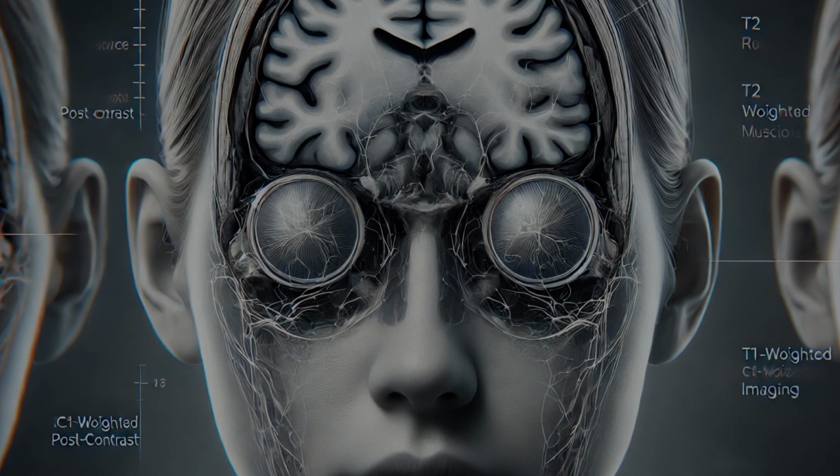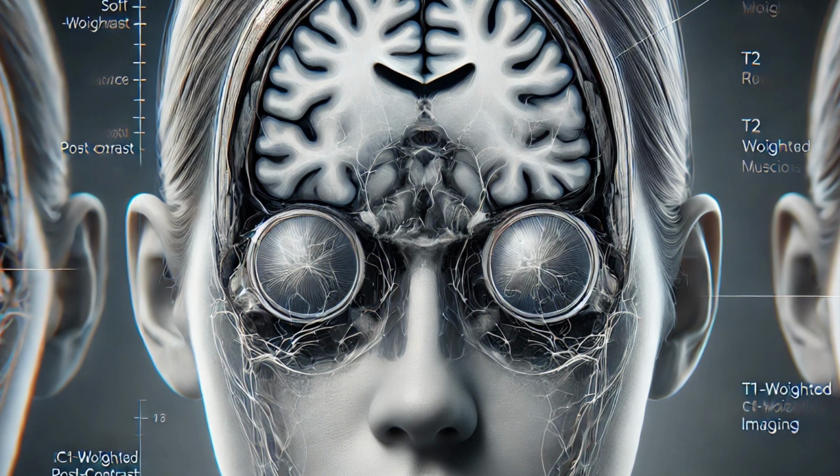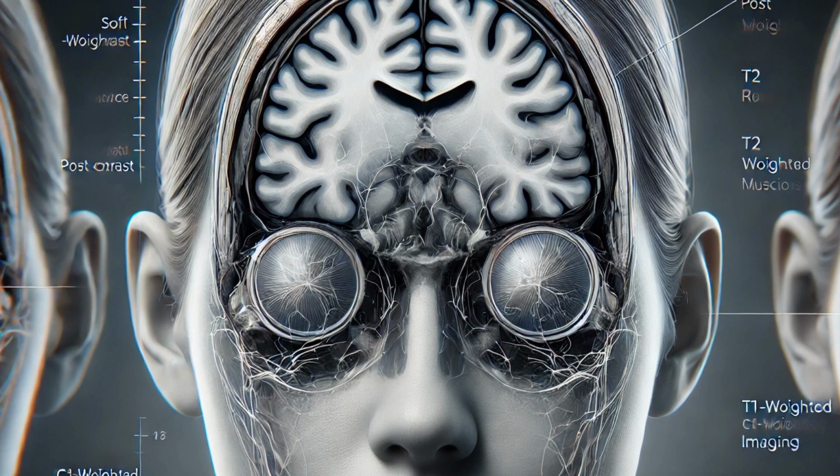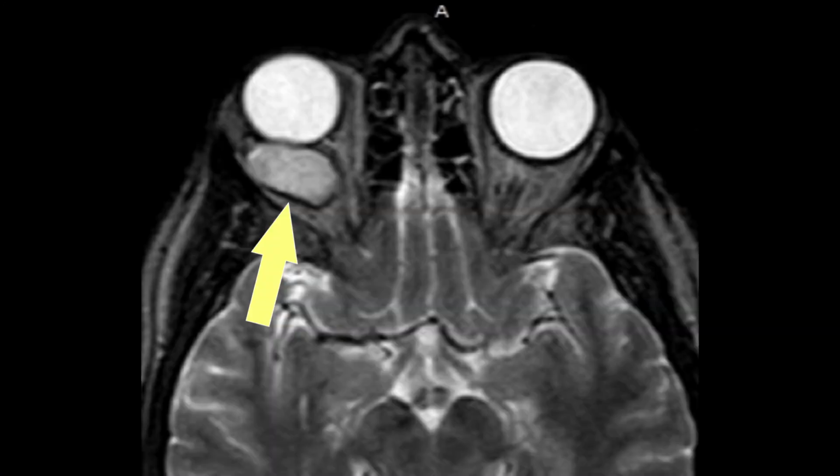This is a 49-year-old woman who presented with blurred vision. In this case, the available imaging study is a magnetic resonance imaging examination of the orbits with axial T2 weighted sequences. On the T2 weighted images, there is a well-defined intraorbital mass located predominantly within the intraconal space of the right orbit with a possible minor extraconal component. The lesion is oval in shape and markedly hyperintense on T2 weighted images. A thin peripheral hypointense rim is visible, consistent with a pseudocapsule.